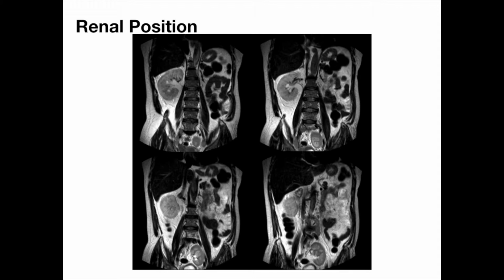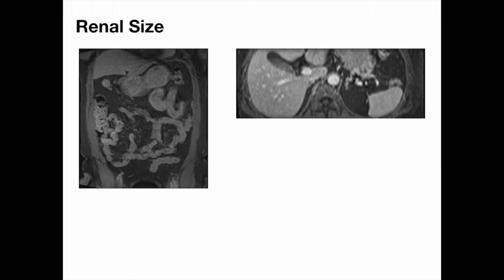With 3D MRI, we can check renal size. So here is a post-contrast 3D fat-saturated T1, and we've got one kidney that's much bigger than the other kidney. That's because that kidney has got an unusual variant. It's a kind of crossed-fused ectopia of the left kidney, and it's about twice the size of the right kidney. And there's a few little cysts and things in there as well.